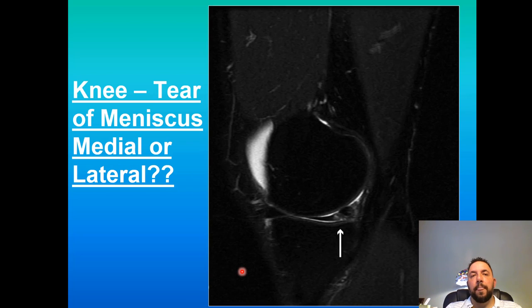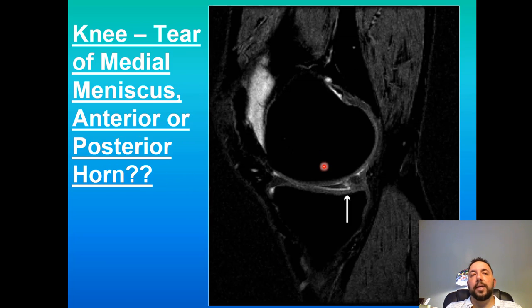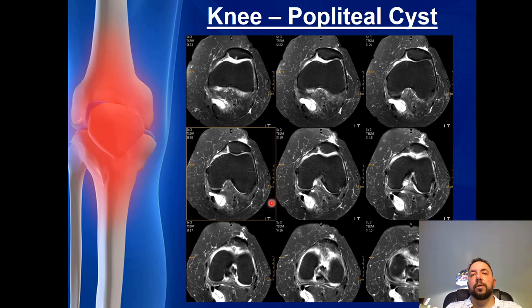We'll say meniscus. Is it medial or lateral? We're going to say it's the medial meniscus. Is it the anterior or posterior? We know that it's the posterior location.